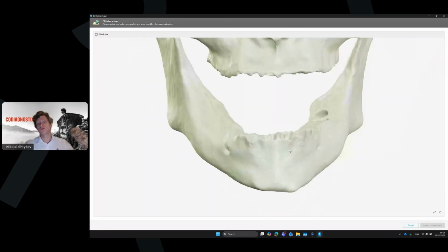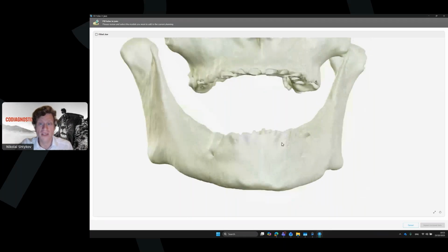And when you need to print this jaw, for example, for a bone augmentation model, as previous speakers also used this bone segmentation for creating bone augmentation, bone grafting, yes, you can use it. You can easily print, and you don't need to spend a lot of time preparing the model. You can separately export the tooth also, print it, and you will have better quality.